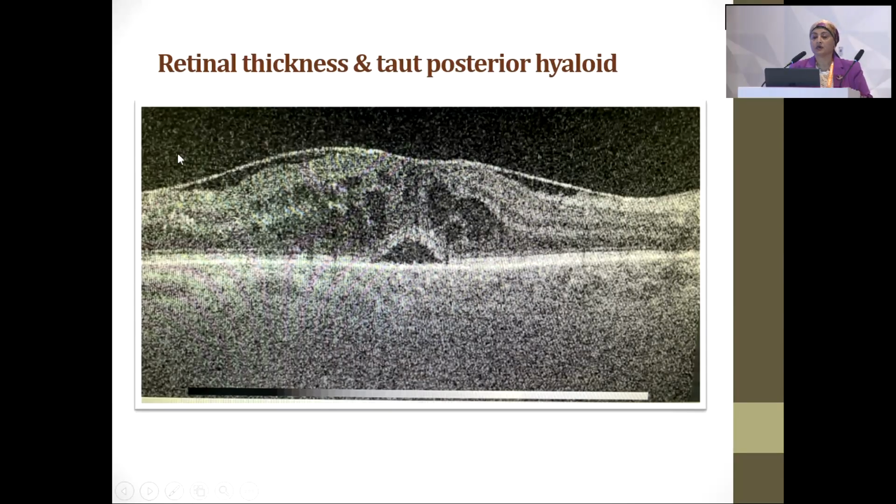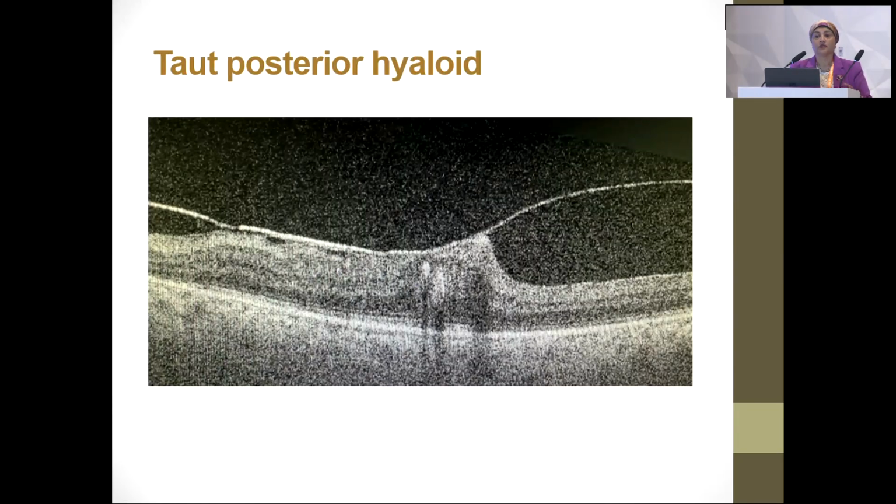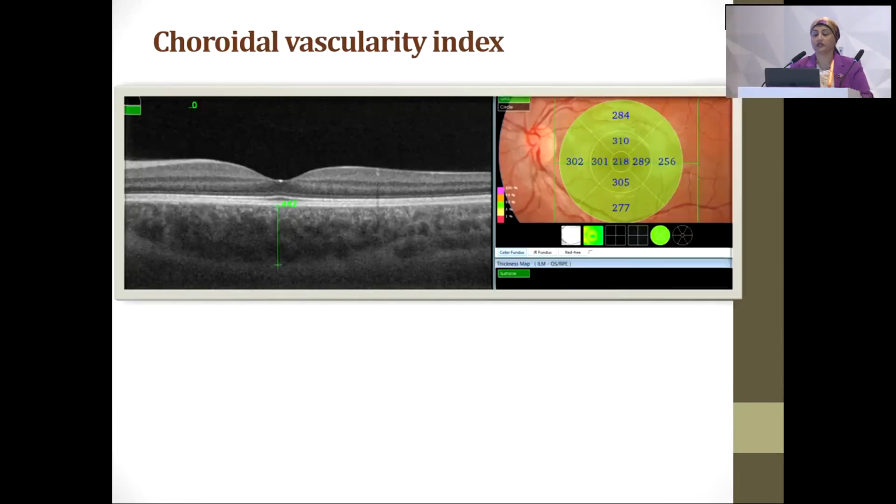If there is epiretinal membrane and intracystic edema, even with subneurosensory detachment, but with the treatment the macular thickness improved and macular edema regressed, but there is still a taut posterior hyaloid with the epiretinal membrane, leading to slight traction on the inner retinal layer.